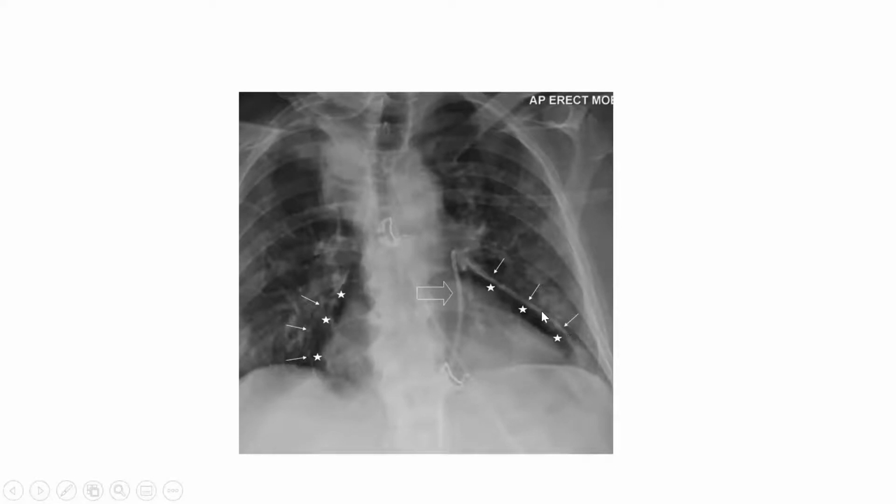This is the parietal pericardium, and this is also the parietal pericardium. And there is echolucency here and echolucency here, but more prominent here than here. So what is this? This is pneumopericardium, which is one of the complications of pericardiocentesis. You can introduce air into the cavity.